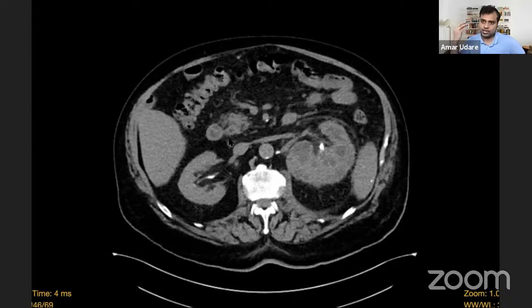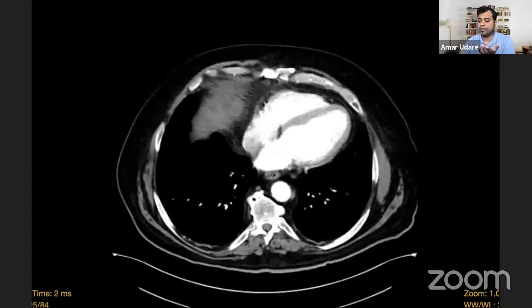So given the presence of a pelvic obstructive calculus and lower density soft tissue in the renal collecting system, what differential or what diagnosis should you be thinking of? Bare paw sign, Anil says, yes, bear paw sign and xanthogranulomatous pyelonephritis. So that's what this was. Left kidney, bare paw sign. Sharmila, Minu, Anil, Arbaz, Jamila, I think all of you got this one correct. This was a case of xanthogranulomatous pyelonephritis.